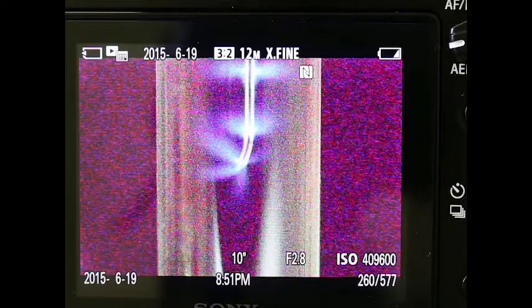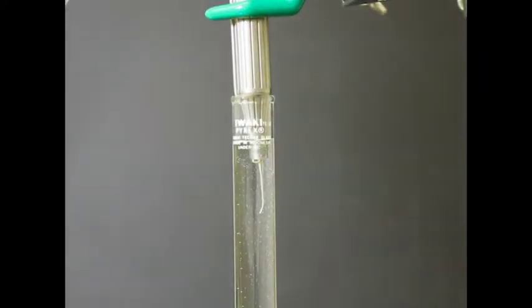We added luminol to the BSS Plus and repeated the experiment. You can see bright light above some distance from where the cavitations are formed. We suspect this indicates spattering of hydroxyl radicals. The video is, pardon the pun, illuminating.